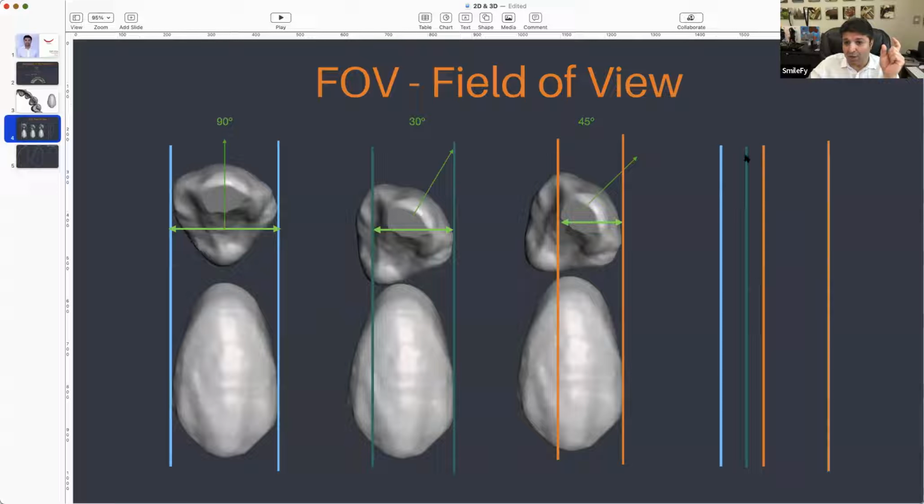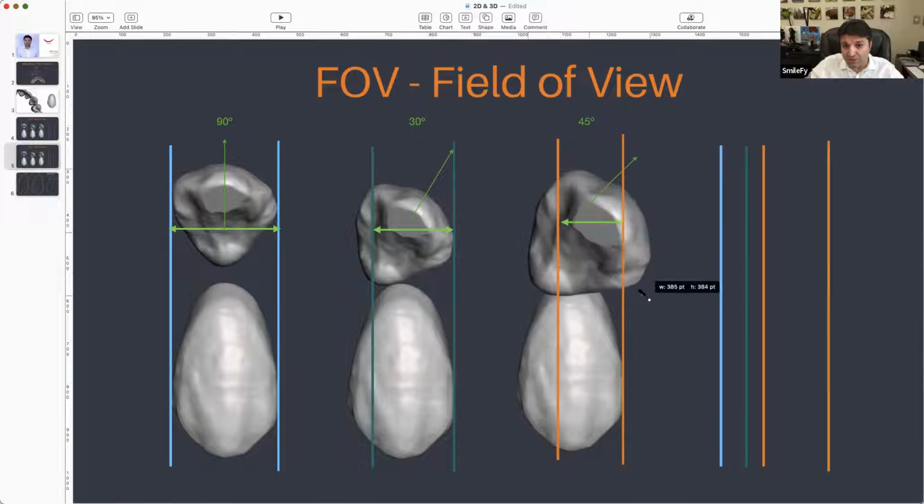And then look how huge the differences actually are in the width, right? So visual width is not defined by the real width of the tooth. The width of what you see in the frontal view is defined by width and even rotation. Because if I rotate the tooth even more in this case, right? Let's increase the width of this tooth like this.